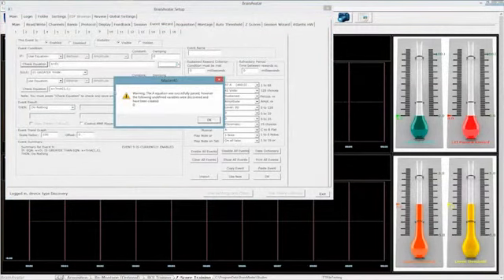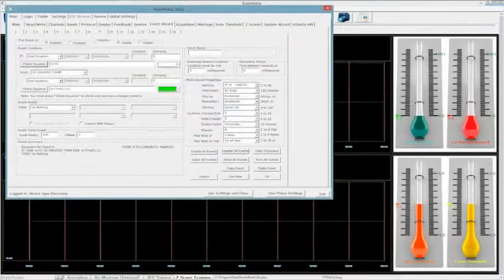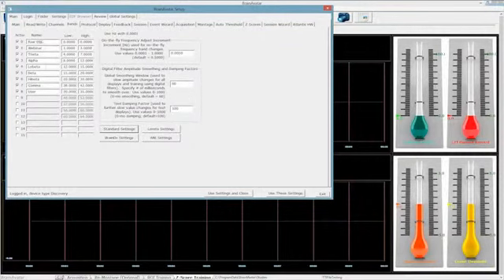As you can see, warning, the A equation was successfully parsed. However, the following undefined variables were discovered and have been created, D. So now we are repurposing what was originally created as delta as 0 right now, because D stood for delta. Delta does not exist anymore.